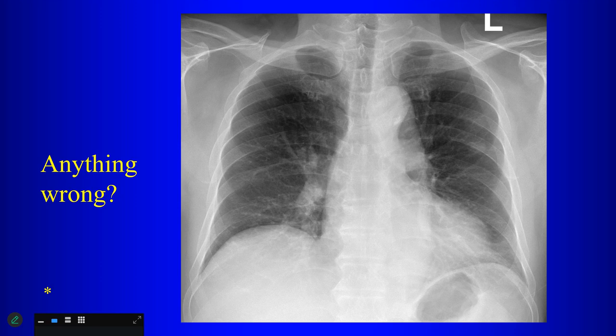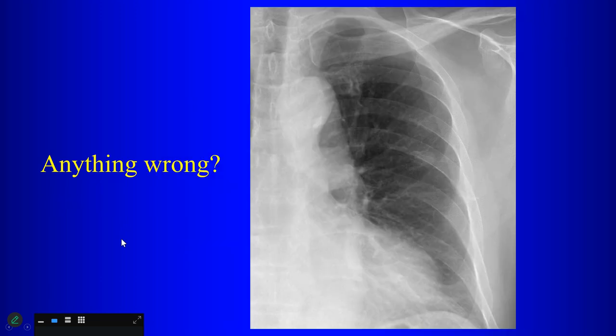Nothing? All right, so you're a little bit looking at that. Anything else? It looks like the descending aorta is a bit distant. There's a tortuosity of the descending aorta. That worth calling a referring physician about? Not really. Anything else? Okay, how about now?